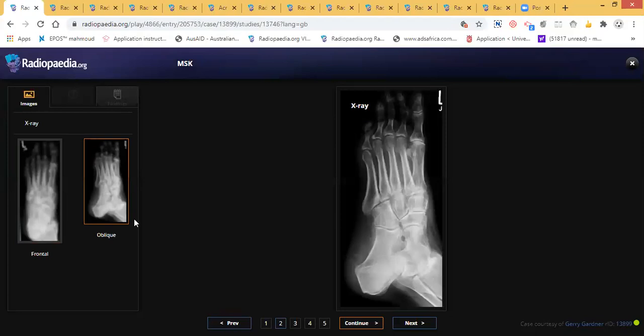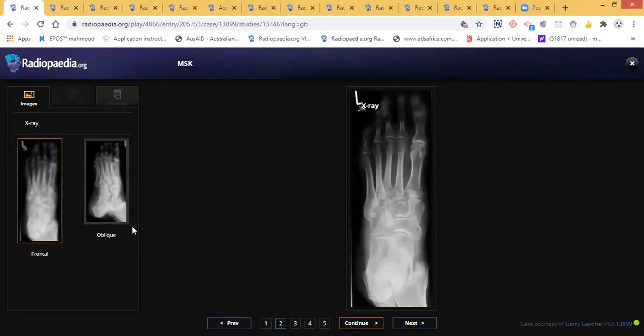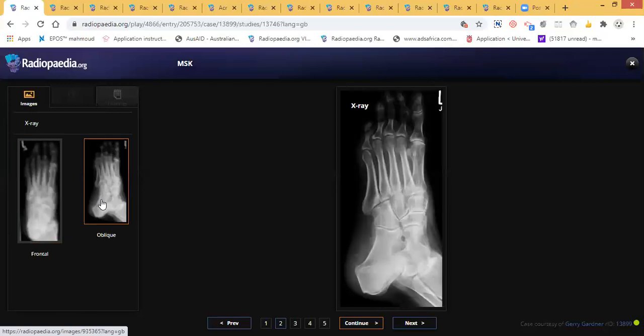Where is it? I see in the comment something about coalition, but I don't agree because I cannot see any coalition, although the coalition may give you some signs. Okay, so yes, exactly. So let's check the alignment. Yes, there is something here in the alignment of this joint.